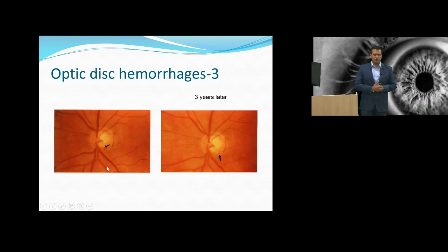Older theory used to suggest that the optic disc hemorrhage is the region where you would see a future progression in glaucoma. So here's an example of a picture of a patient that had a hemorrhage in a particular region, and 3 years later, they developed a notch right about there. Now we know that individuals with optic disc hemorrhages are common. Glaucoma patients get them often.